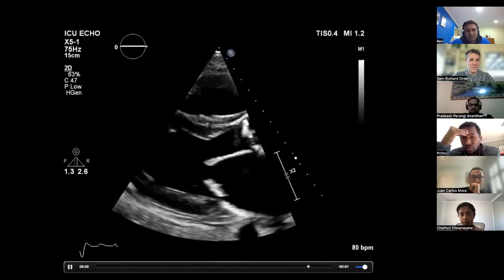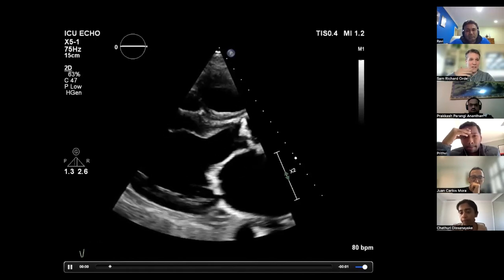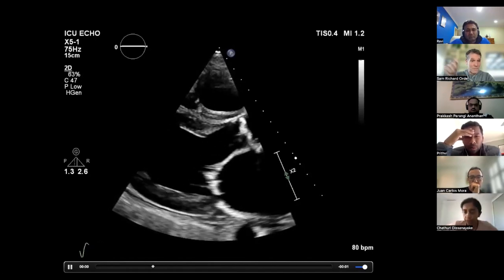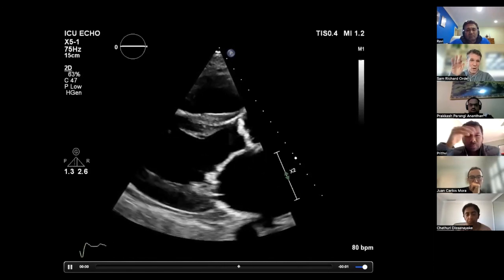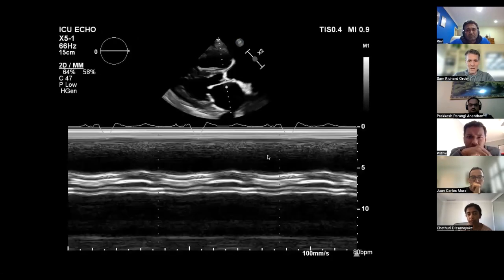Beautiful, nice. So just take me there, because again, simple things. That would have been a definite tick mark in there. Is the mitral valve the major valve abnormality here? No, it's going to be that.